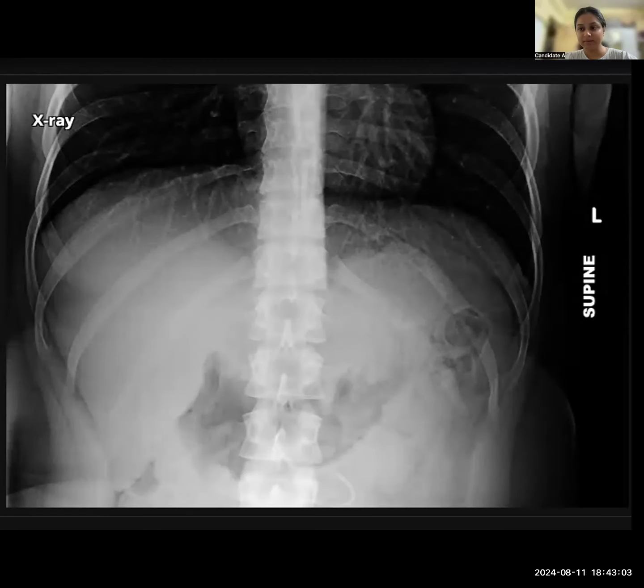Yes, you are. So when you're given a case like this, and I give you a history that there is a previous renal procedure done, always look at the corners of the film to see if there is any implant or any stent. In this case, I do think it's quite difficult, but when you look at the corners here, you can see an implant projecting, right?